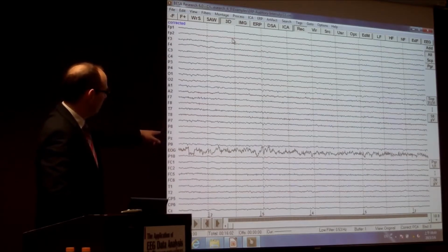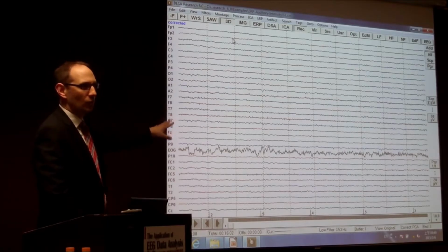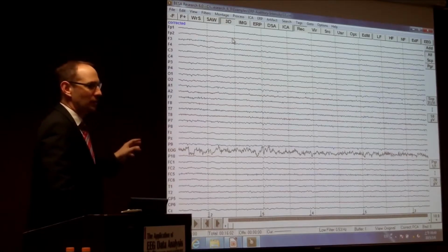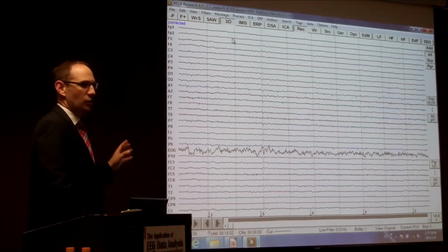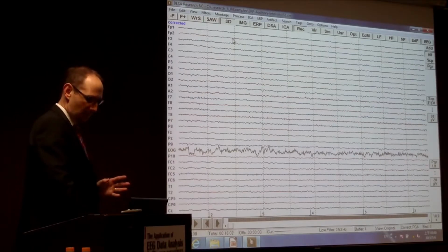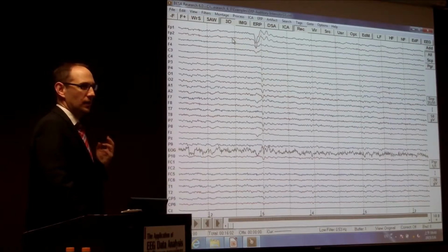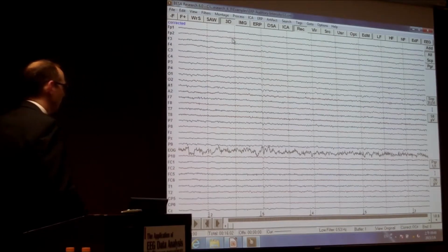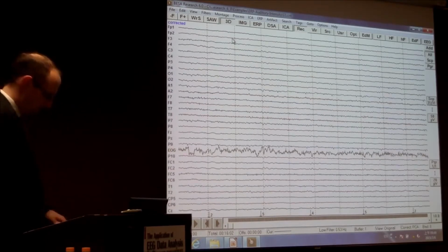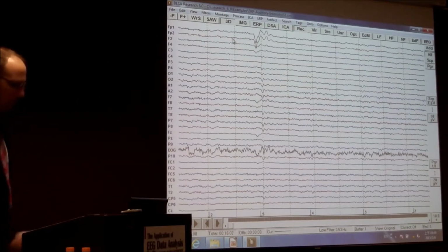And you see that everything is now calming down a little. So what you see, basically, all of the data is influenced. It's not only this channel, it's not only getting out the eye blink, everything is influenced. So you always have to take care about that. If you do something like artifact rejection, it might happen that your whole data is looking a little different afterwards. Okay, just push this out. But there's also another possibility.